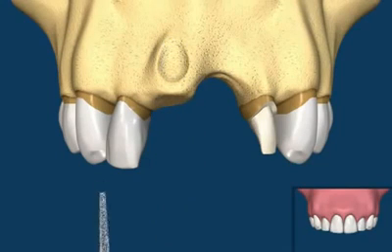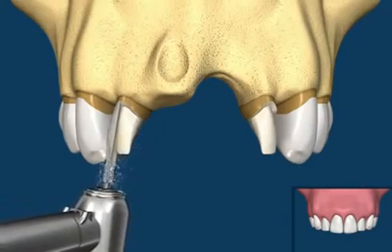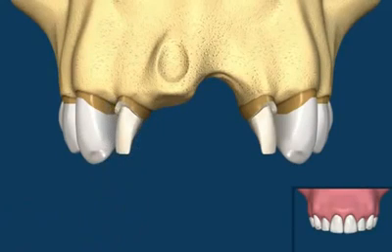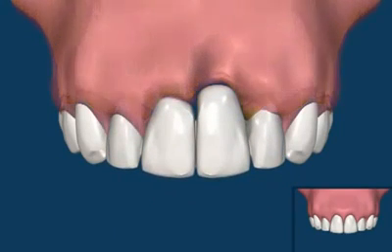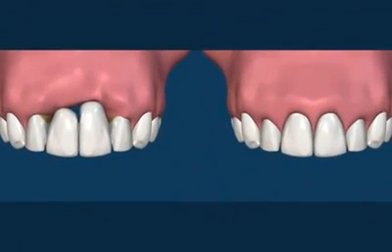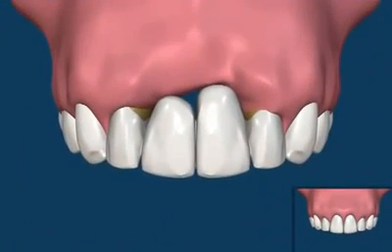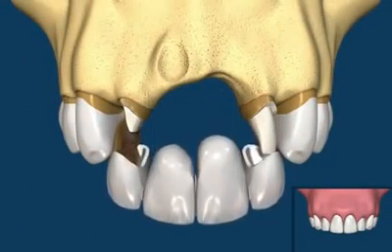To continue with the bridge option, we again need to cut down another tooth and make the bridge bigger. A 4-unit bridge can then be placed on the two prepared teeth. This bridge will not look as good as the original due to the bone loss. The process of atrophy will continue as before. Comparing the two results now clearly shows the destructive possibility of the bridge with time.